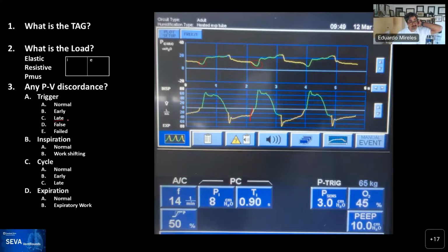Comments, Rob? Yeah, getting back to what you were showing, how the patient can actually exhale before the ventilator cycles inspiration off. That's due to what they call an active exhalation valve. Some ventilators have it, some don't. Some modes have it on some ventilators and other modes don't. And this is a situation where on this particular ventilator, the ventilator will display an inaccurate tidal volume because it subtracts out that negative volume.